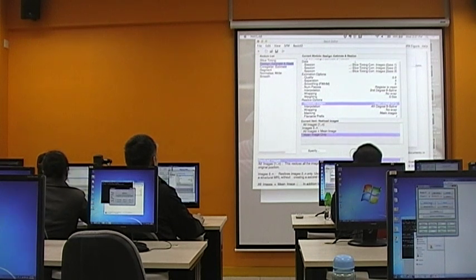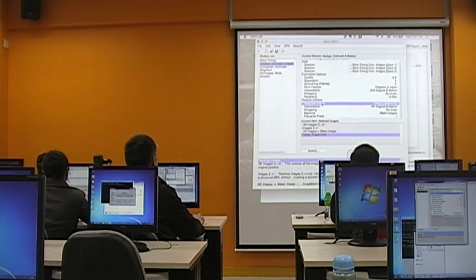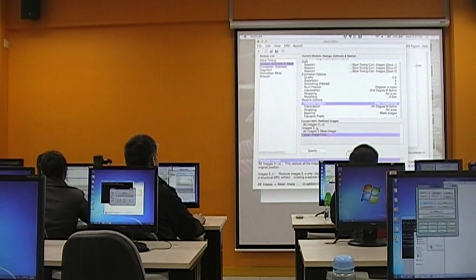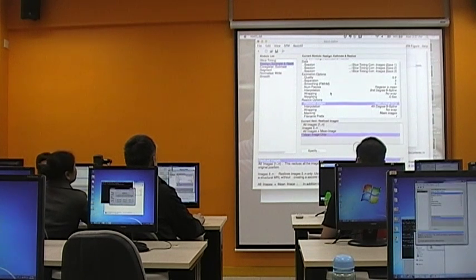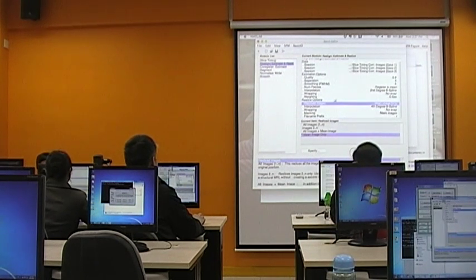So what you need to do is only choose reslice images using, from the default option of all images plus mean image, to mean image only. Okay? That's the only option you need to change.